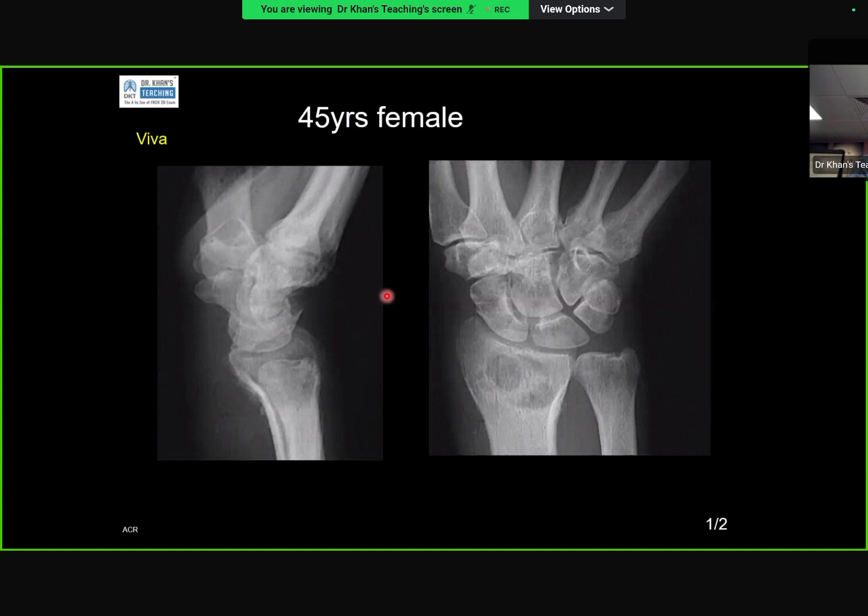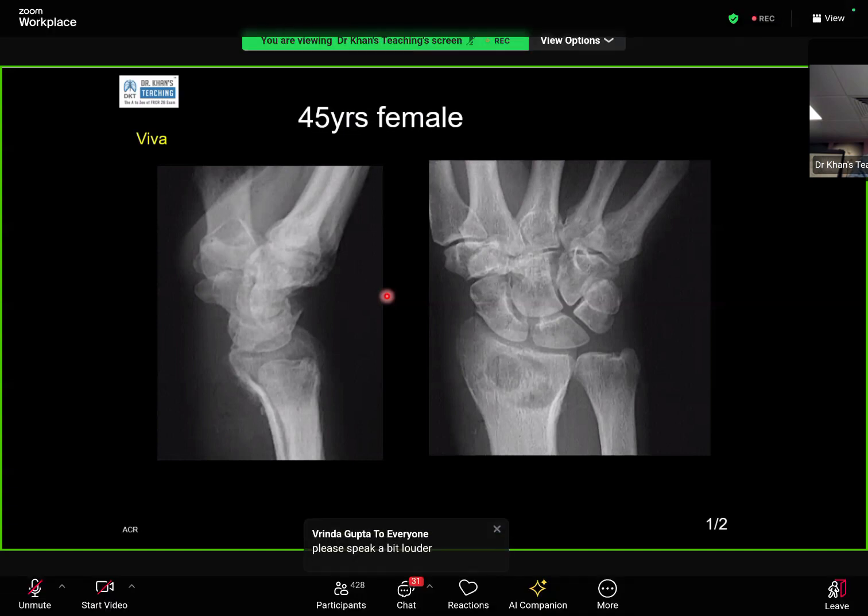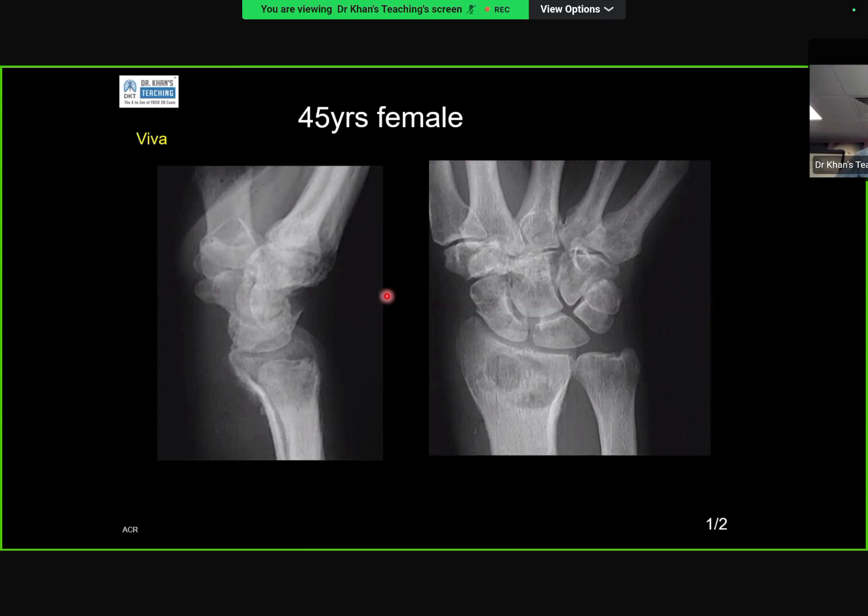So it's an aggressive bone lesion causing possible pathological fracture, and there is reduced joint space of the radiocarpal joints and the radioulnar joint, and the rest of the carpal bones show normal, no similar lesions are noted. There is an interrupted periosteal reaction which is well appreciated on the lateral projection. So aggressive bone lesion in a 45-year-old female patient, I would think of infection, one possibility. Other possibility will be a metastatic lesion. I would inform this finding to the referring clinician and discuss the case in the orthopedic meeting.